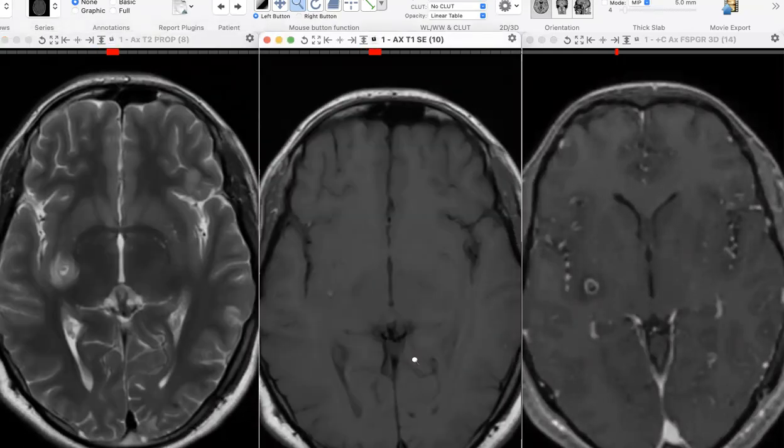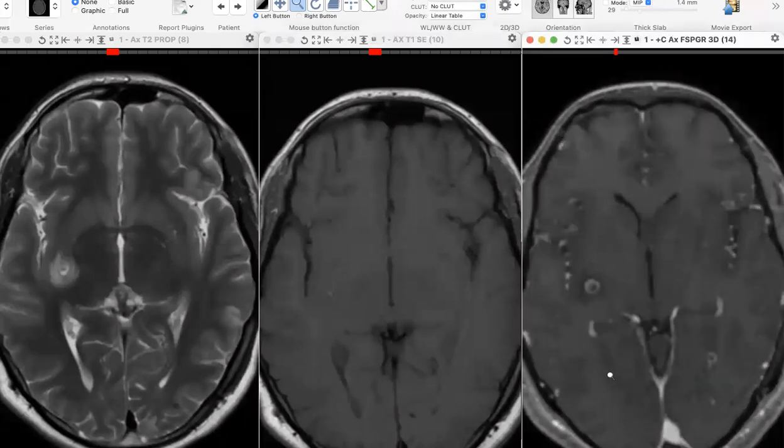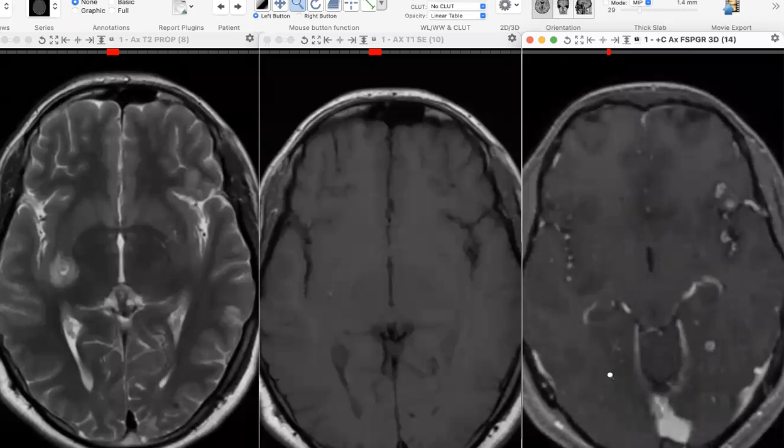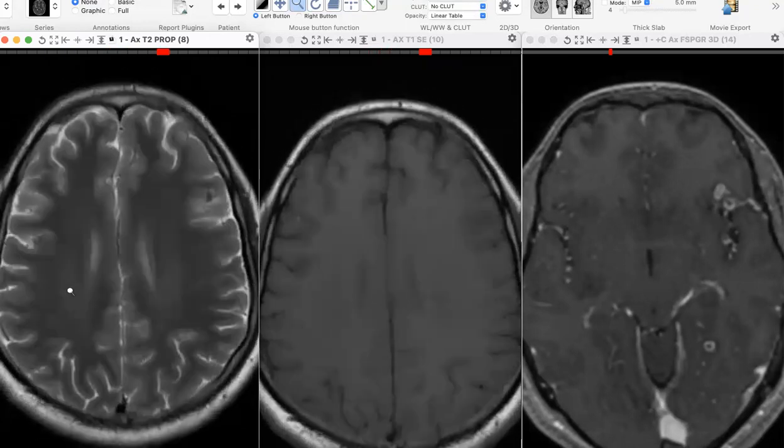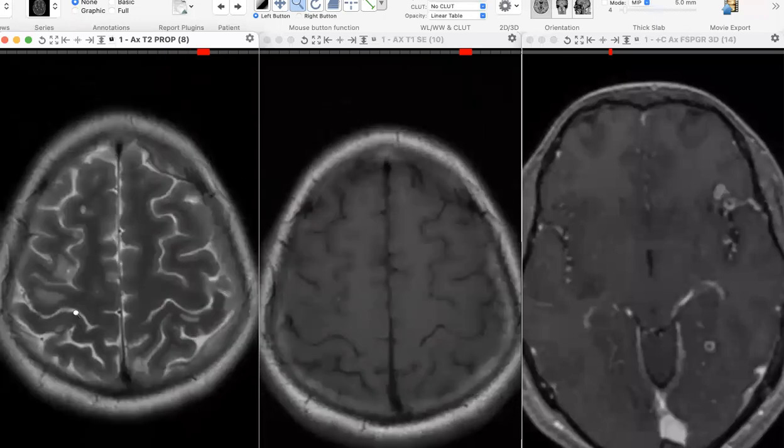And sometimes, in the post contrast, I don't know whether this is innate T1 hyperintensity or there's something enhancing, but you call a nodule within a cyst a target sign, which is also a sign of neurocysticercosis. So this is the second stage, which is the colloidal vesicular stage. And then the organism is dead, so obviously it will start to retract. The lesion itself will start to retract, and it starts to undergo granulation. So you see over here, there's a retraction. It is still hyperintense, but the edema is becoming less and less with these lesions.